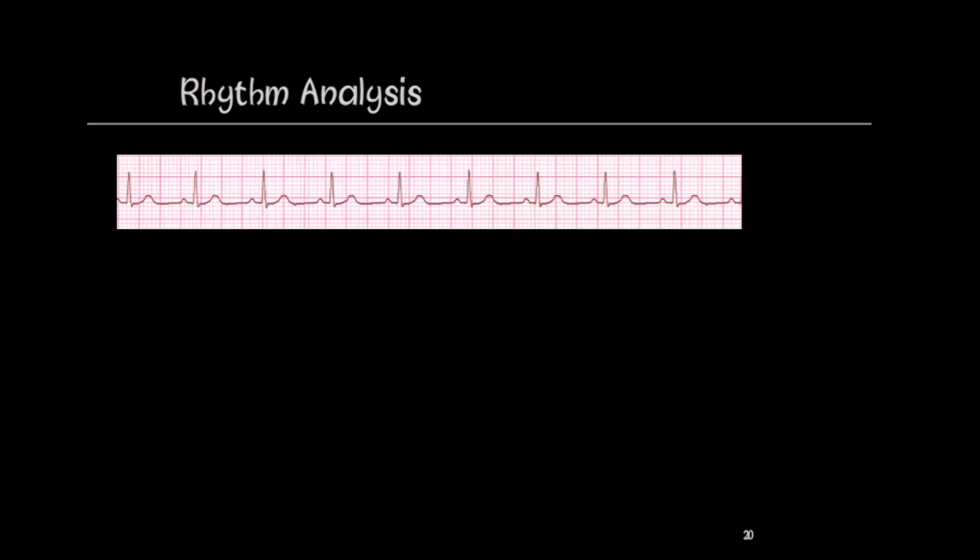In this video we are going to be discussing all the different steps of rhythm analysis. So let's take a look at the following steps.